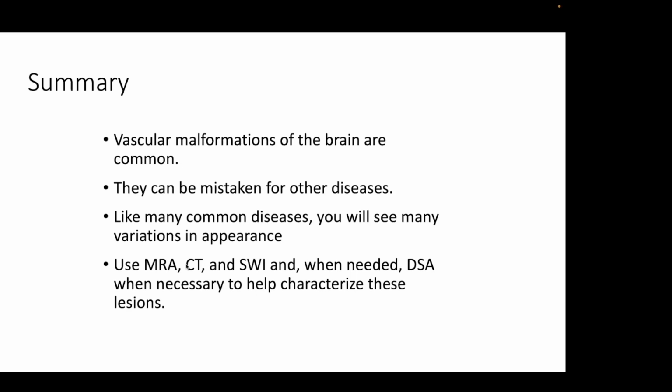So in summary, you should be looking for these malformations because they are so very common. They can be mistaken for other diseases. And one of the problems that I think you probably got a sense of looking at these cases is they can vary considerably in their appearance. And so you'll see small DVAs, you'll see giant DVAs.